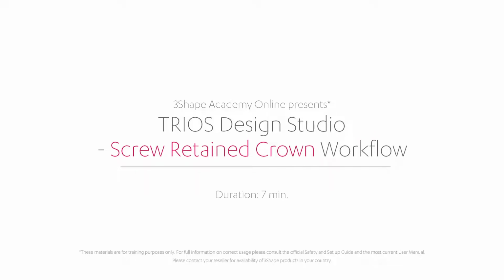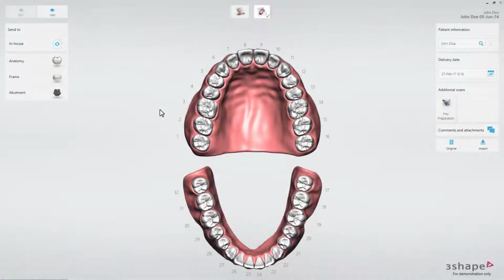In this video you will learn how to design and produce a screw-retained crown restoration for a patient that already has an implant. All of this is done in-house. Screw-retained crowns will be offered as an integrated workflow in TRIOS Design Studio. It will allow dentists to offer immediate production of screw-retained crowns on the same day, with a significant time saving and a reduction in production costs.